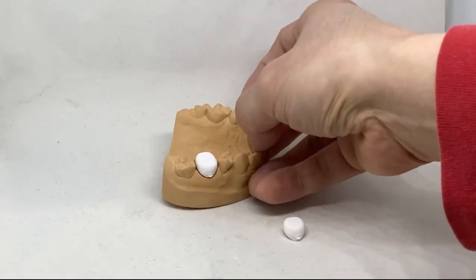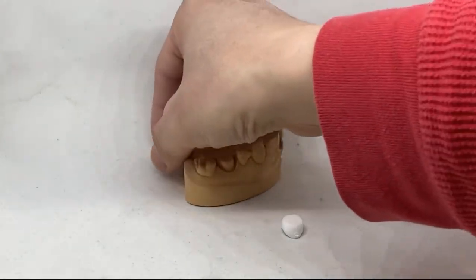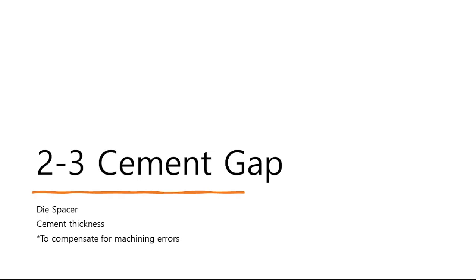Flip the model over and it falls right off. This is a result of early contact in the line angle. Our next topic is the inner design of a crown.